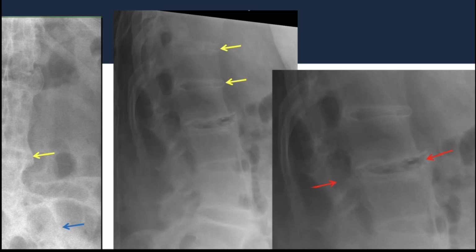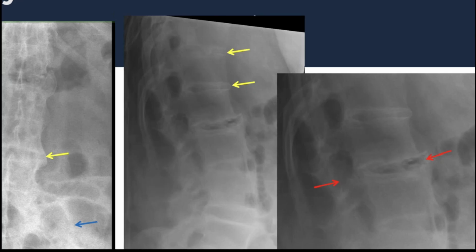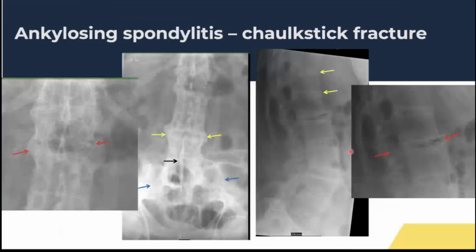So these are called syndesmophytes, and I don't know if many of you have heard of them as of yet, but they're a specific type of ossification that you get within ankylosing spondylitis. So ankylosing spondylitis is a progressive ankylosing entity, which means progressive fusion of the spine, and can occur in multiple different entities.